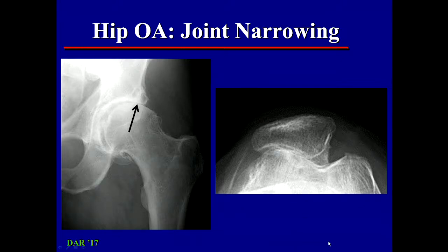Just like this patient does not have lateral subluxation of their patella. The patella is sitting over laterally because we've lost all this cartilage here and none of the cartilage here. So there's just less space here and it looks like it's moved. Now, if we think about the hip joint, where the hip moves is going to depend on where we've lost the cartilage. So superolaterally here, but we could have also lost cartilage superiorly or inferomedially or medially or even superomedially.